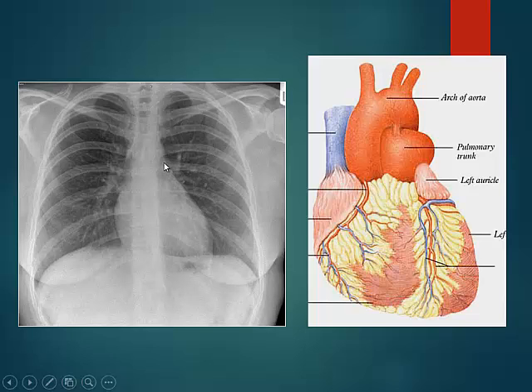And then above this here, what do you have? What is the structure I'm pointing to? That's the pulmonary trunk. The main pulmonary artery leading posteriorly into the left branch, and this passes over the left main bronchus, which you can just see here. Between the pulmonary trunk and the left ventricle, there is generally a bit of convexity, and that is occupied by the left atrial appendage, right? And then you have the aortic knuckle formed by the aortic arch, this structure here. Okay.